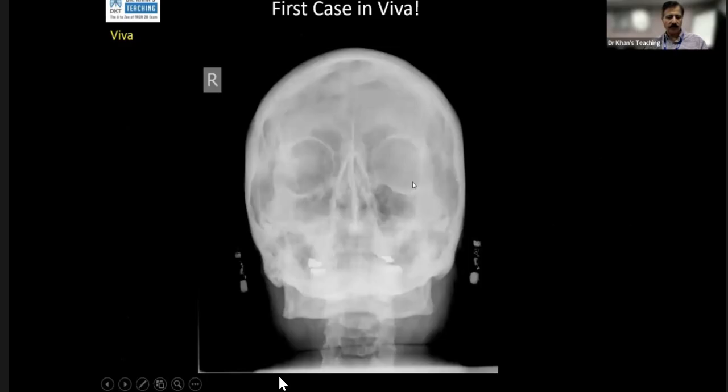Yes, please. Is this a rapid reporting film? Sorry, it's a Viva case. So this is an X-ray skull AP view. There is non-visualization of the left innominate line representing a bare orbit. Maybe projectional. The patient has got history of trauma. Over to you. Okay, there is right inferior orbital wall fracture with the opacification of the right maxillary sinus.